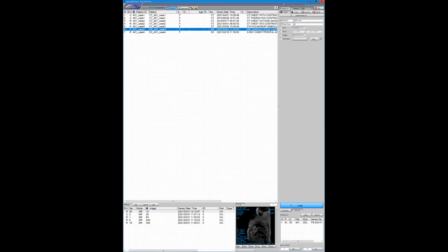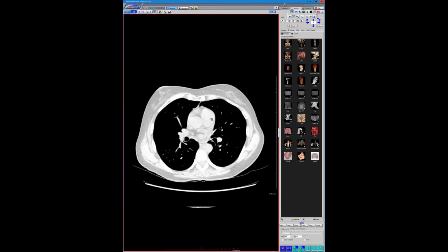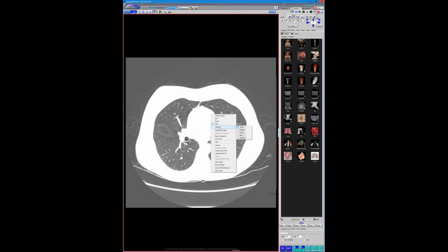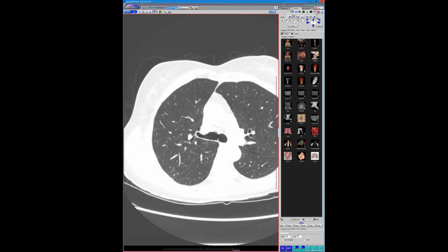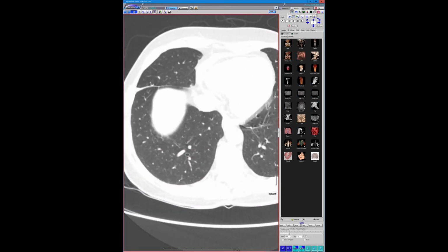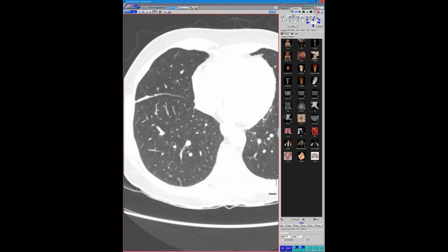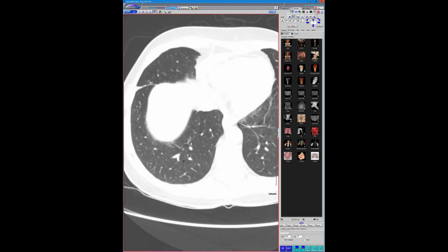But I have to. I didn't pull those over, because once I recognized it anatomically, I didn't go much further into it. This is an interesting case because it shows multiple pathology. This is a patient who, and we've shown many of these cases before, had these numerous little nodules, and you can see some of them. They're all over the place.